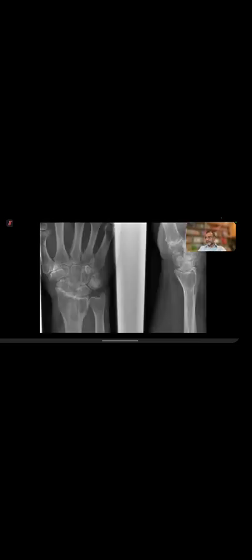Okay, another example. So what do you think is happening here? This patient was sent to us from a DGH because we were a bone center at that time. So they asked, is this a giant cell tumor? The patient was in their 60s. Do you think it can be a giant cell tumor? Yeah, very good. Because we are discussing CPPD, this is probably a large geode.